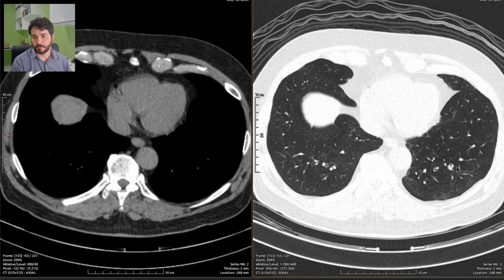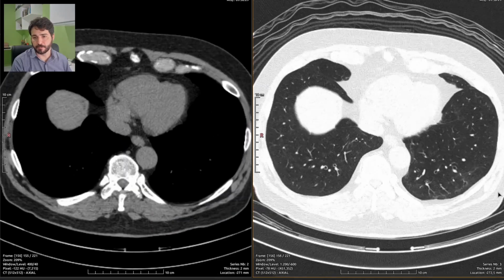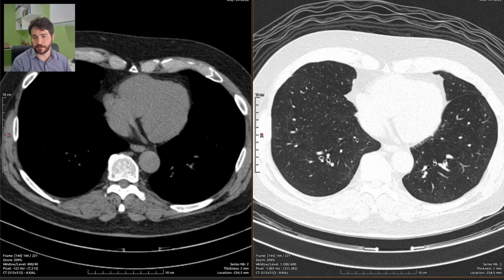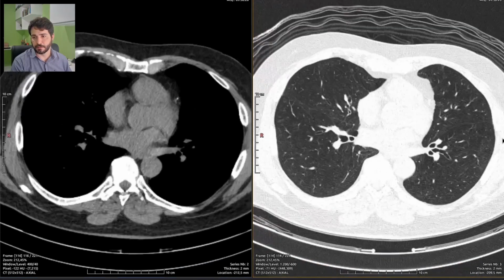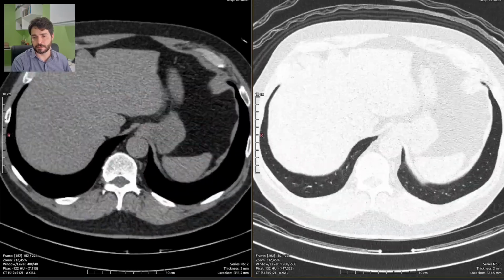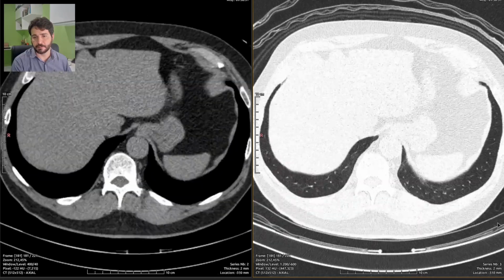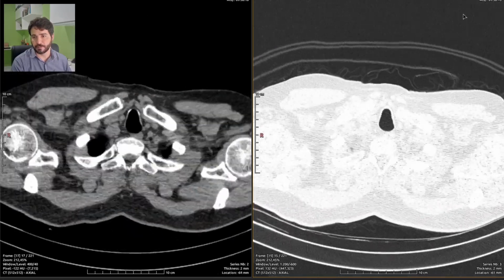Some very little anomalous content on lower lobe bronchus, airways, just like this. Thickened walls and partial filling of the bronchi, just like here. So this is an acute bronchopathy, or something like that. I can't really pronounce it properly.